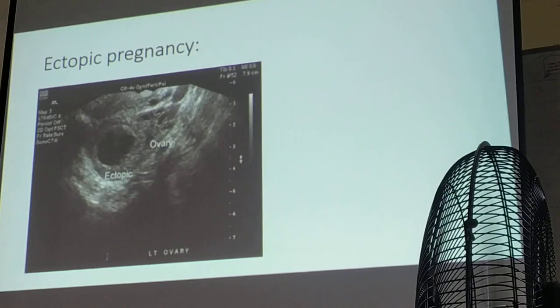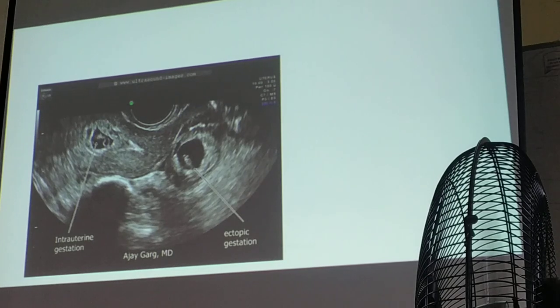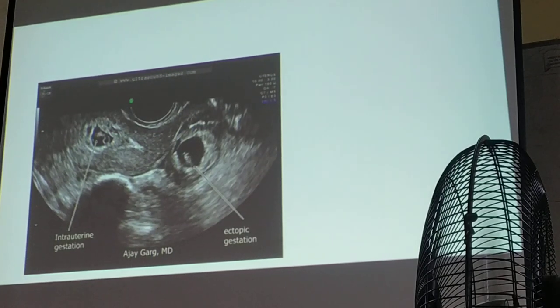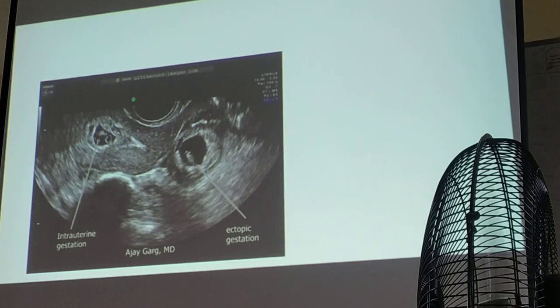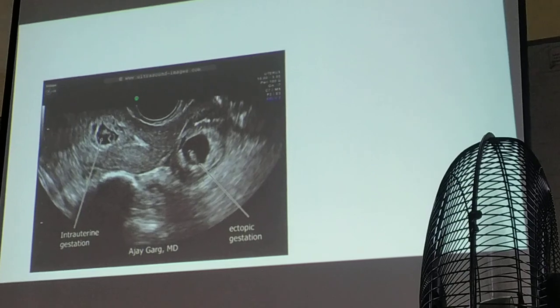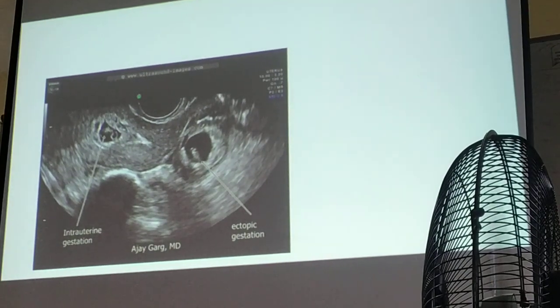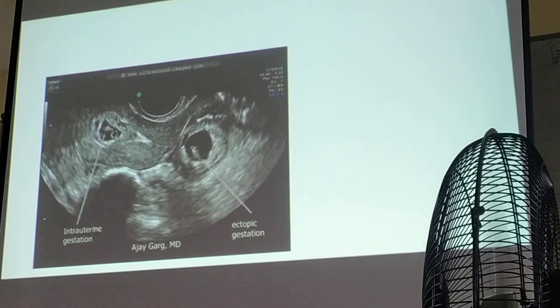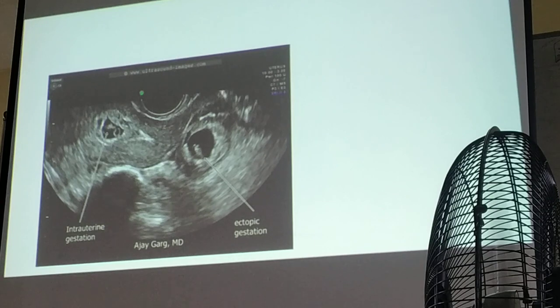And then this one, what type of pregnancy is this? Heterotopic pregnancy. Okay. This is heterotopic pregnancy, okay? One is intrauterine, the other one is ectopic.